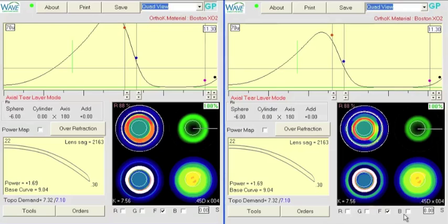So I'm not going to switch it at this point because the lens was originally designed in freeform, but in a case like this, I think G-SYN would work very well. Along the same lines, I'm going to be making my changes in 100% mode. We're going to apply this change throughout the entire lens until proven that the patient really does need a more complex lens design where we're making meridian changes independent of other meridians. I just like to keep things as simple as possible. And so we're going to do everything in 100% mode.